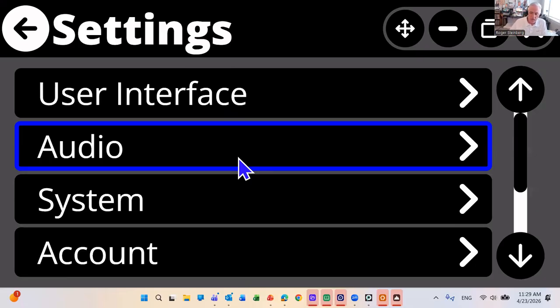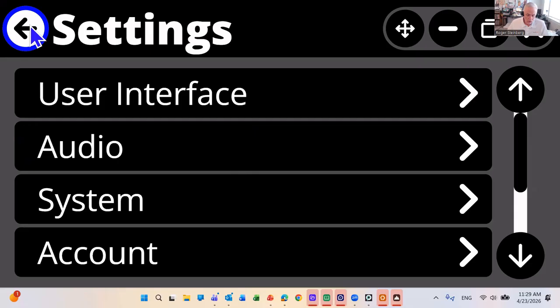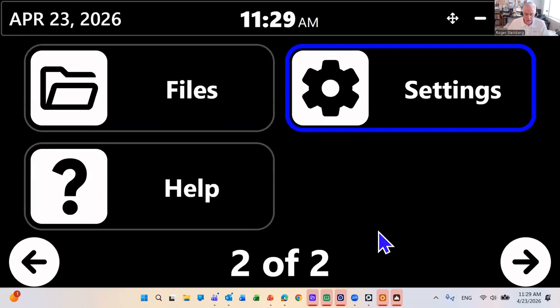So those are really the settings that you would want to interface with immediately when you're getting started with Prodigi. And it's always good to sort of highlight those up front. So notice my interface. I'm back in my carousel now. I tap that back button in the upper left, and my carousel now has more icons on the screen at one time. I see my blue locator around settings, which is what we just exited out of. And my entire interface now is being presented in a black background with white as the contrasting color against it.